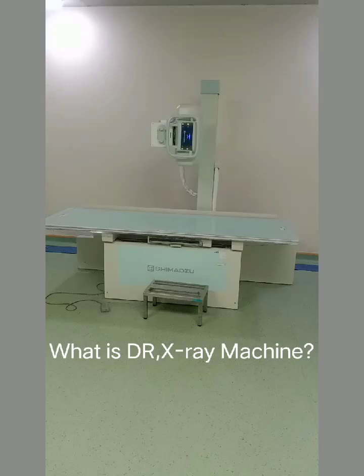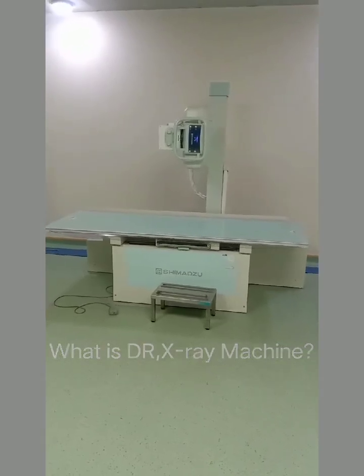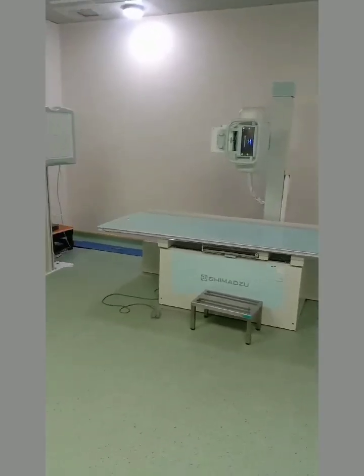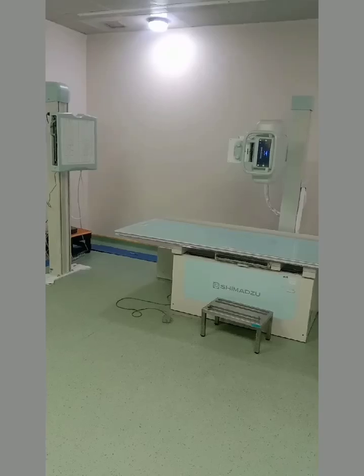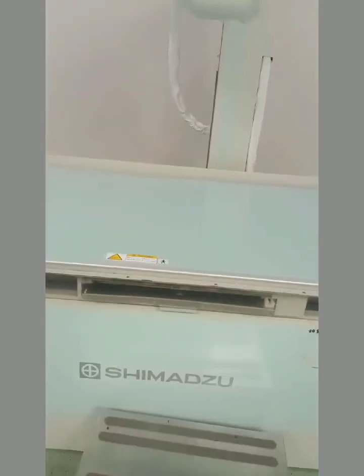In this video recording, I will explain a little bit about computed radiography and digital radiography. CR and DR machine. This is a DR machine through which we can take the radiograph of the patient's body. I'll explain now what are the parts of the DR machine.